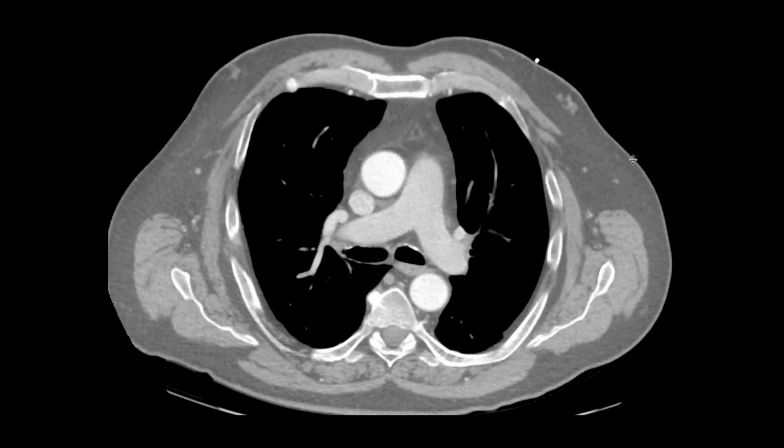And this time I do have a cool teaching case for you guys. It's not an interesting type of case where I see something and wish I could write it up and publish it. No, this is more of a teaching case and a lesson for CT technologists. This is something I want you guys to be careful about going forward. This is one of the no-nos that techs can cause all on their own. This is something that's all technologist dependent, right?